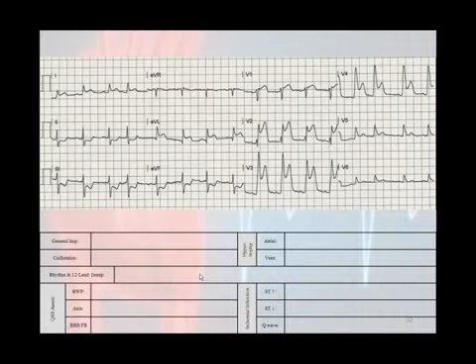Now take your quick glance. Did you see anything that looked excessively fast, excessively slow, or ugly? Hopefully just by glancing at this, you don't have to be very well trained in the EKGs to know that this right here is a very ugly morphology. It actually looks a little fast as well, so we're going to say that ugly morphologies. Calibration, if you look over here to the left side of the 12 lead, you actually have standard calibration.